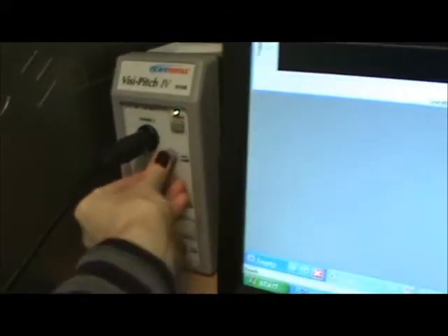So if it's too low, it looks like this. Now it says you want to execute a macro. I don't know. I'm going to hit no. So if it's too low, your sample will look like this. We'll hit yes to erase and start over. And I turned it down, so this is what too low looks like. You can see now when you hit the space bar, it looks big again. But when I was actually talking, when I was doing the note, you can see the sample was really small.